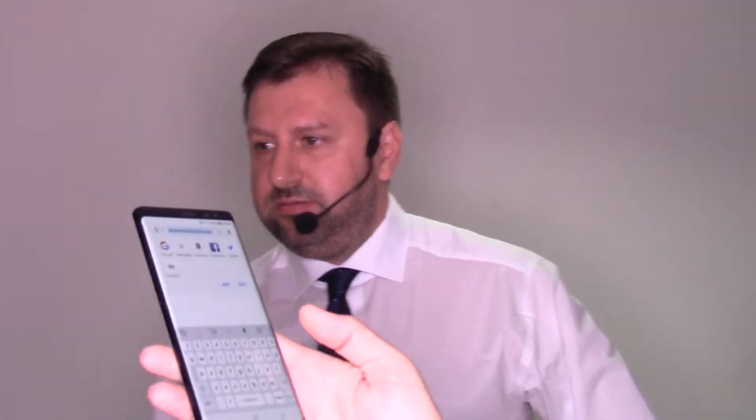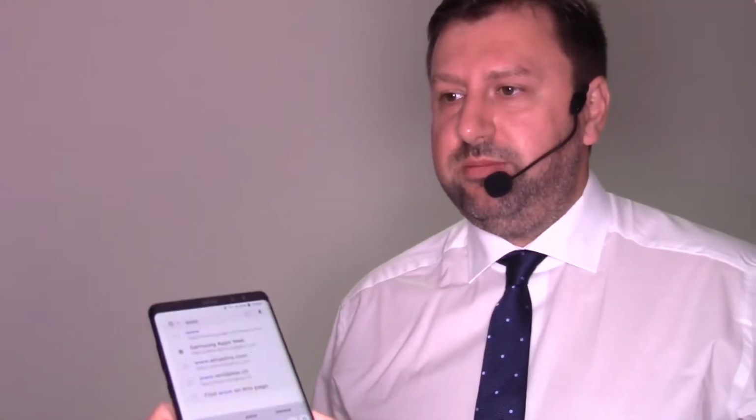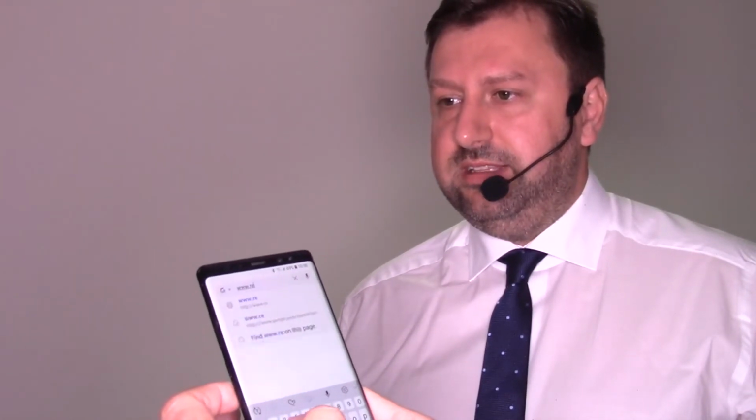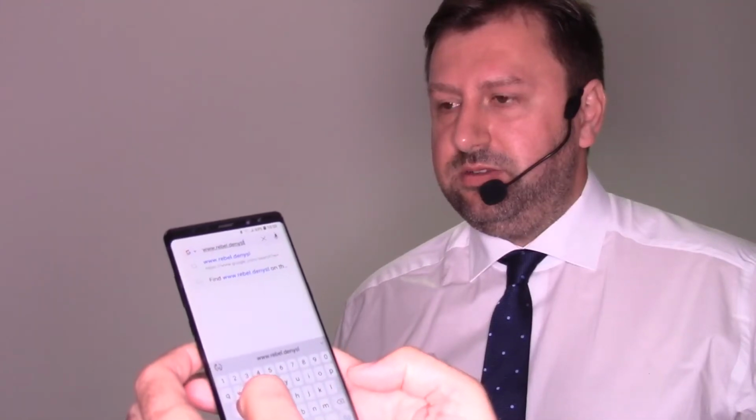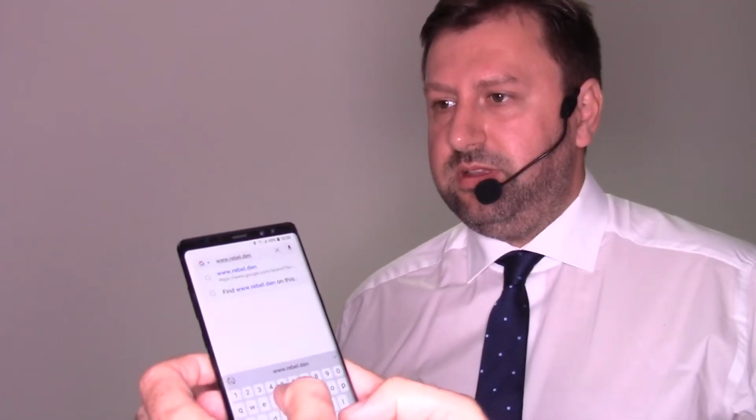Now, with the help of Professor Hardan, we will show you how you can do this through the mobile application of Rebel. As I told you, it is an online service, so you have to be connected to the internet. You just log in through your web browser. Yes, we are on www.rebel.dental. You just log in.